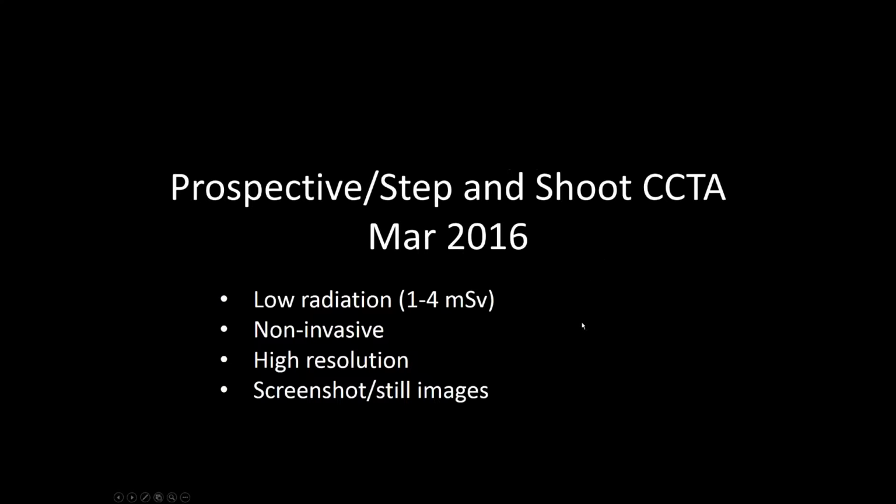So moving on, because of the echo, the next step was to analyze what's going on with the patient's vessels. So what we ended up doing the next morning was getting a prospective step and shoot CCTA. And so we're in March, and so what happened, this is a low radiation test, a high resolution test, and because you're not really going in there as in a cath or something, it's a non-invasive test.